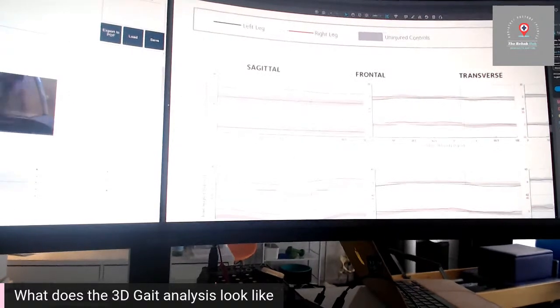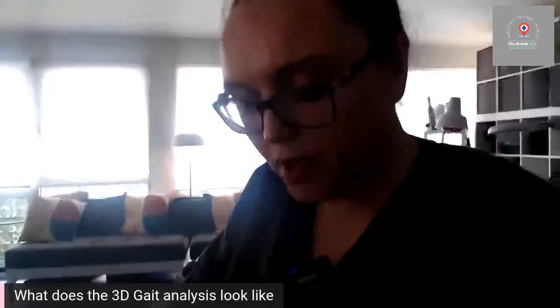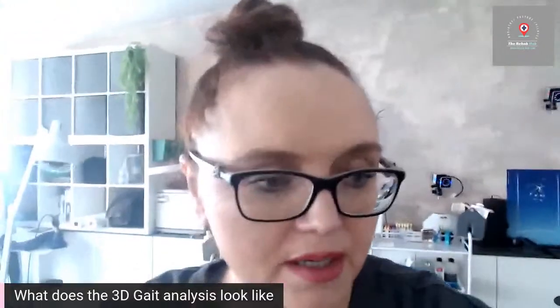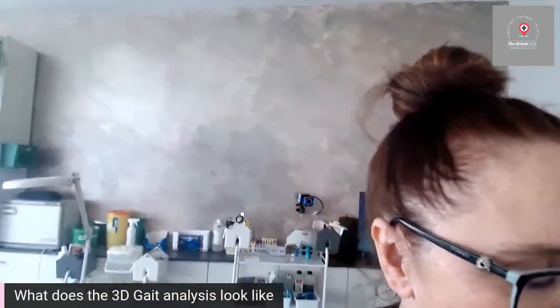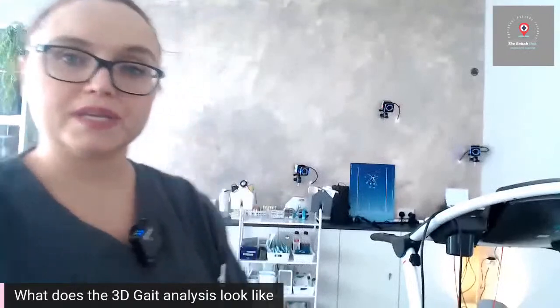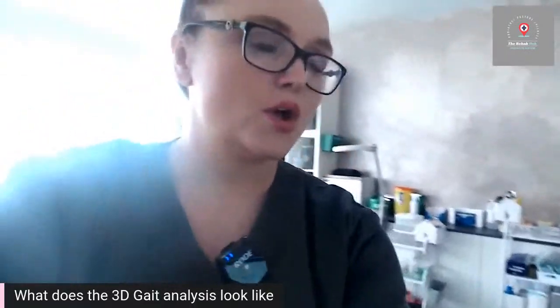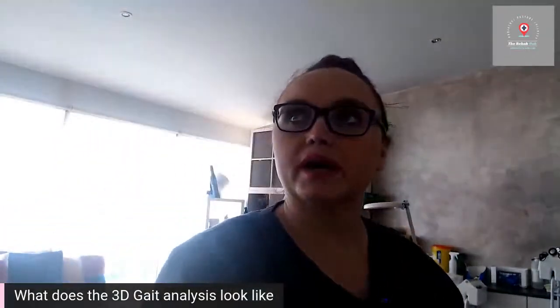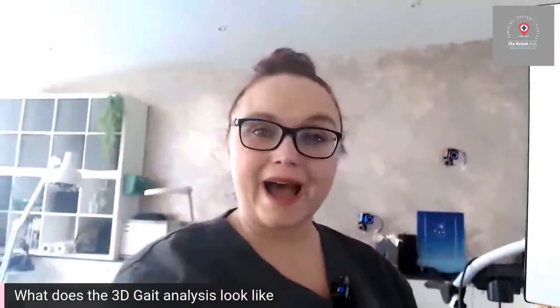So if I just turn this around so you can see me. So ordinarily as clinicians, and I'll bring this around so I'm in the light, when we're analysing our patients, a lot of our analysis can be a subjective analysis, meaning we are maybe watching them walking on the treadmill, or we are filming them. We might be using an app or software.